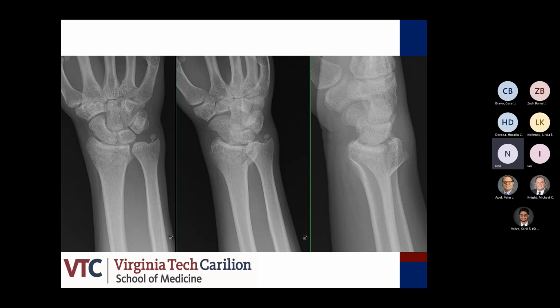Looks like some loss of the inclination, a little bit of dorsal inclination. Tough to tell without a contralateral about the radial height as compared to the ulna there. But yeah, that's what I see right there.